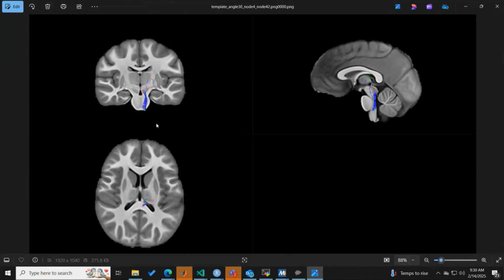But what I don't like is that, I mean, not don't like, but what's happening is you saw it's actually popping and exiting, which means what? X forwarding might not work. If you have a Mac, like you could sit in the imaging bay or something, where you don't need the X forwarding, because I don't know if mrview.